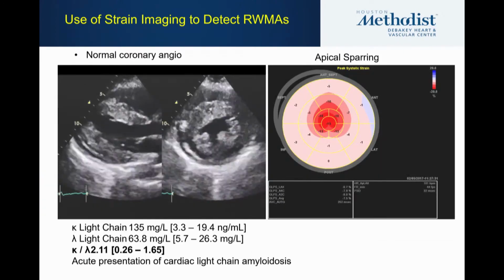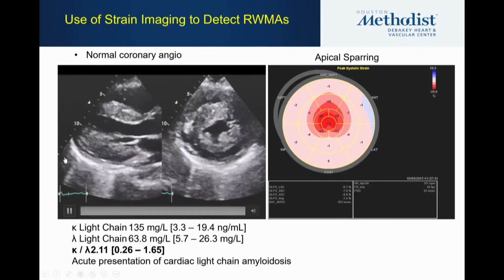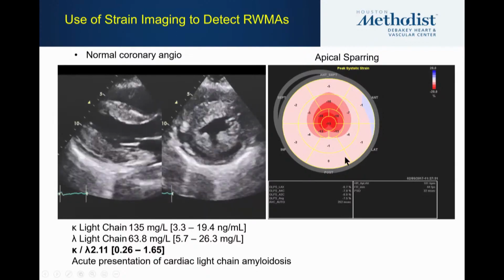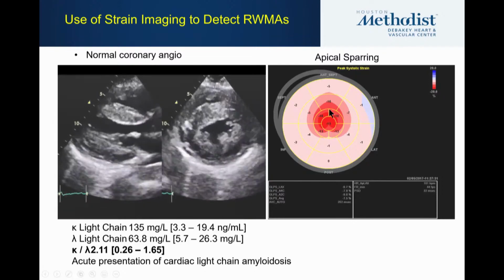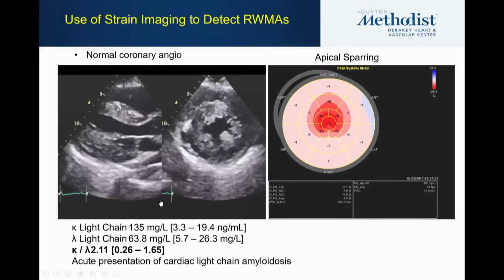Now, here we have a patient with amyloidosis, actually severe amyloidosis. The ejection fraction is already depressed, severe increased wall thickness, small pericardial effusion, very bad GLS. I mean, the average is terrible. The average is about 7%. But the apex is spared. This is what is called apical sparing, which is not 100% specific for amyloid, but should make you think of amyloid when you see, at the same time, findings like this.